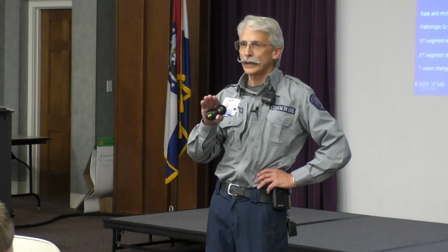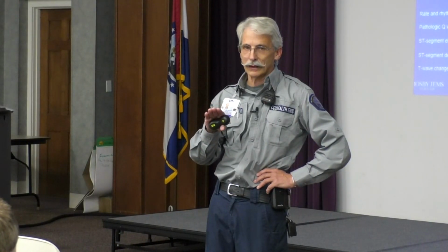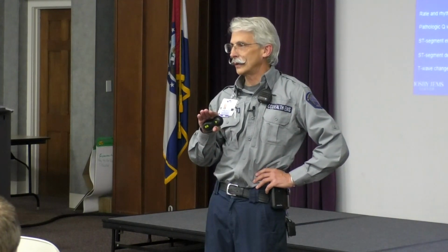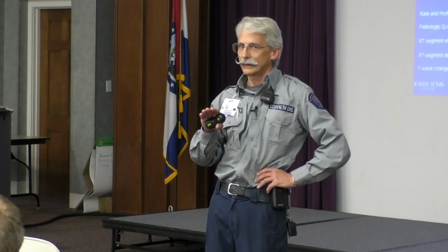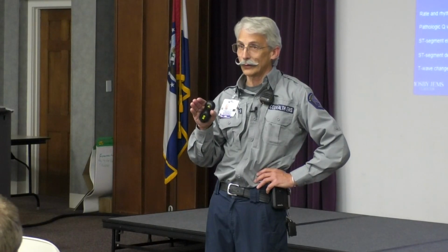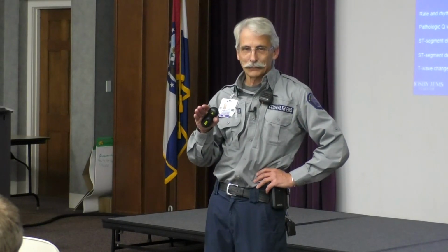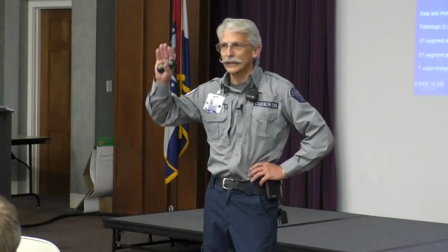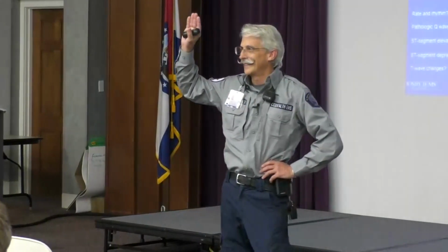When you're talking on the radio about this stuff, don't say that I have elevation in 1 through 4, because they're going to go, well, you're nuts, because leads 1, 2, 3 are okay, but there is no lead 4. But there is V. There's V's. Hey, who knows what the V stands for? Vector? Nope. Ventricular? Nope.